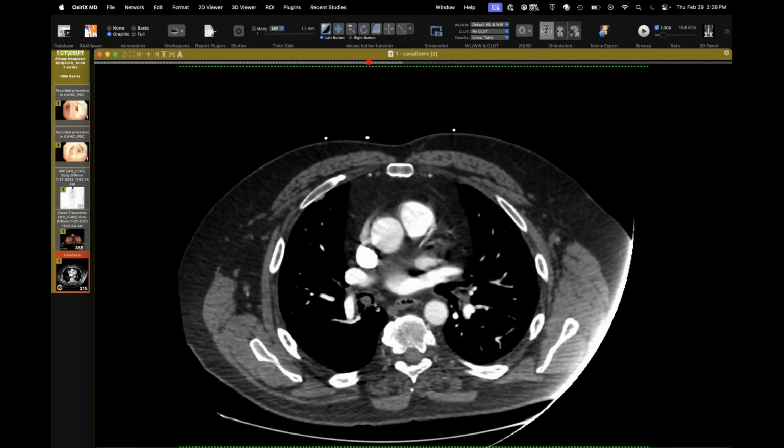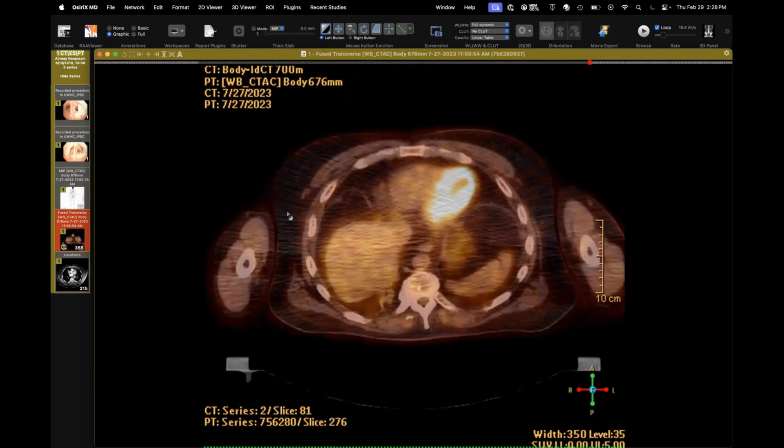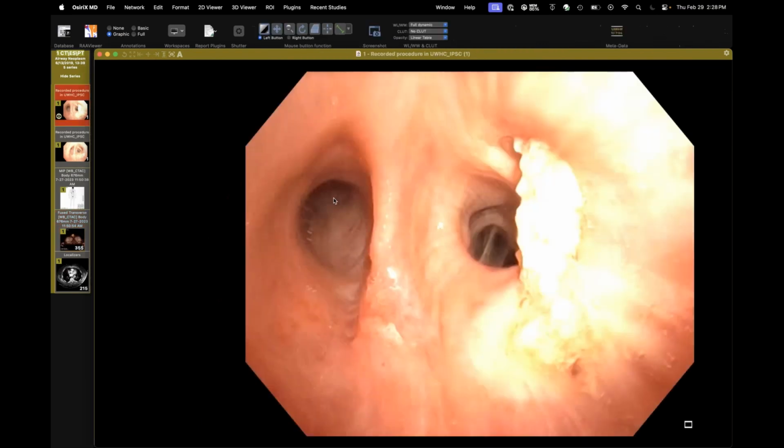Of course, melanomas like airways. On metabolic imaging, they were just seeing if there were mets anywhere else, and this thing is very hypermetabolic. So they went in, and there it is on the bronchoscope. They biopsied this, and it was a spindle cell neoplasm. It took a lot of creative immunocytochemistry on the part of the pathologist to work this up. But ultimately, this was determined not to be a melanoma, but rather an inflammatory myofibroblastic tumor of the airway.